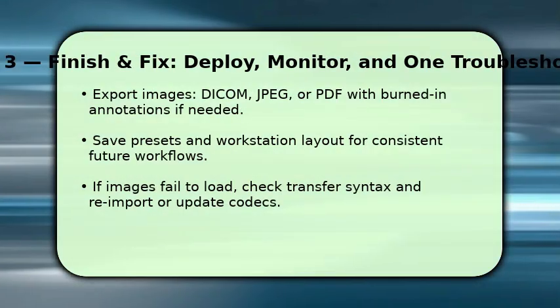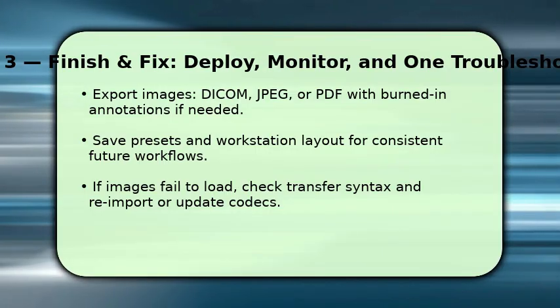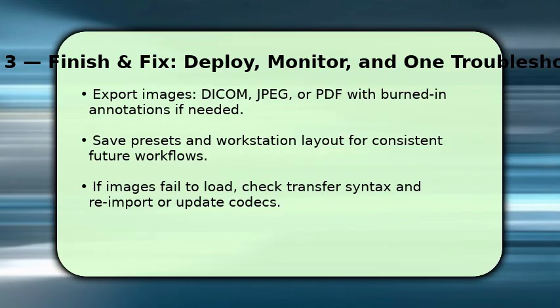To finish, export and document your findings. Save key slices or entire series as DICOM for PACS or as JPEG/PDF for reports. Include burned-in annotations only when required. Then save your viewing presets and window layout so future cases match immediately.